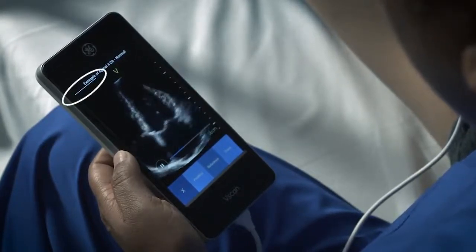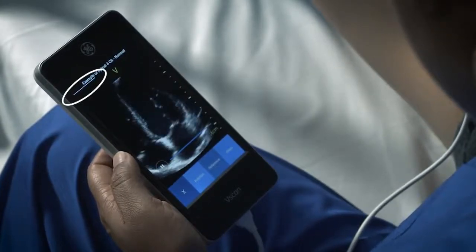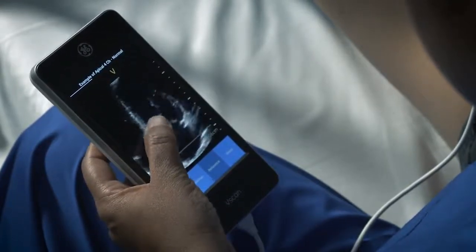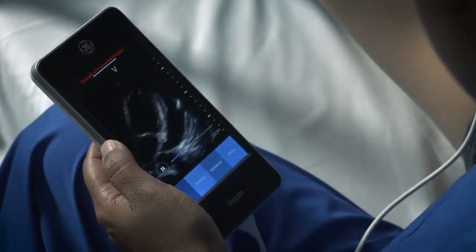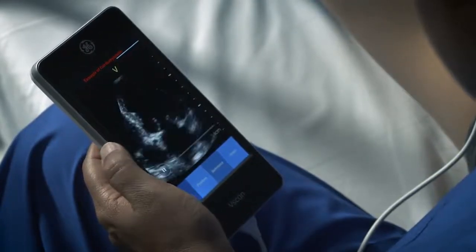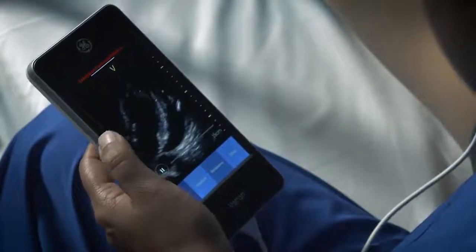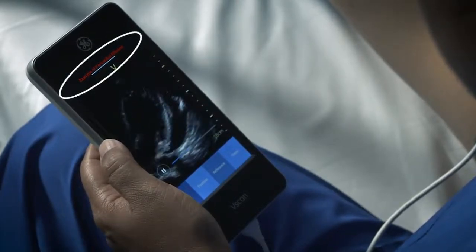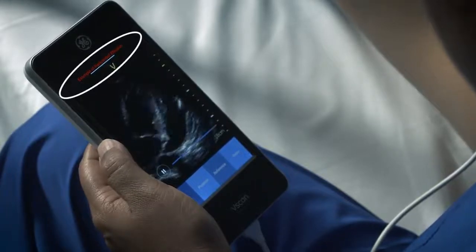The progress bar will appear at the top of the screen to give you an indication of the number of reference images that are available. These reference images include normal anatomy and a few examples of common pathologies for these individual scan planes. Here you can scroll by swiping left and right through the examples. Reference images that are highlighted with a red image annotation indicate an abnormal reference, as seen here.